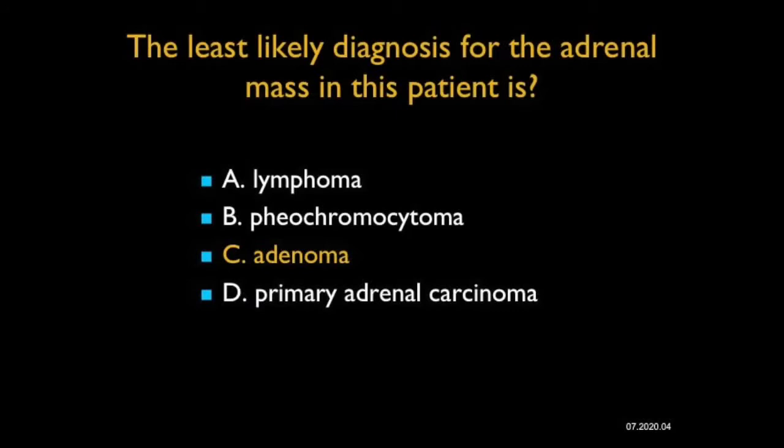Adenomas, occasionally very, very large adenomas, I guess, can theoretically rupture, although I've never seen one. They can bleed, but this is more an infiltrating process, which to me suggests malignancy. And in fact, this was a pheochromocytoma that was malignant, which infiltrated the perirenal space.